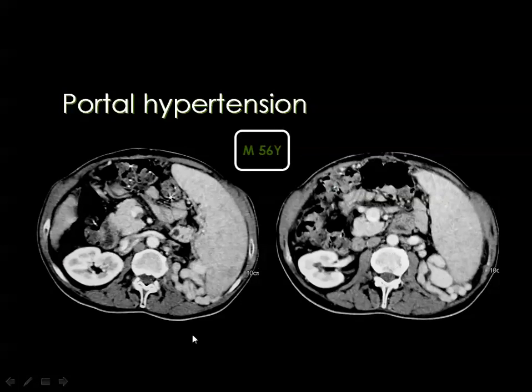But in imaging in patients with portal hypertension, you can see multiple dilated tortuous collateral venous channels around the spleen and at the gastroesophageal junction and also in the abdominal wall.